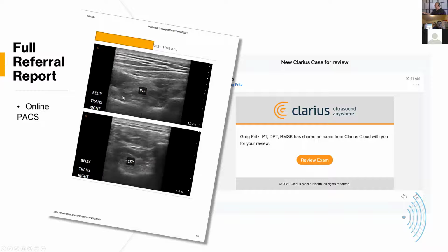And you will also find that there's the infraspinatus image, which has that teres minor view and the infraspinatus, as well as the deltoid over the top of it. And for your own information, in this particular study, it's important to point out that all of the shoulder muscles showed a certain part of fatty infiltration. So all of the muscles were deconditioned. Now, if the upper trap was healthy, if the deltoid was healthy, if we saw that the teres minor was healthy, but that there was a single muscle that was deconditioned, that would be able to say we have a focal area to work on exercise-wise.